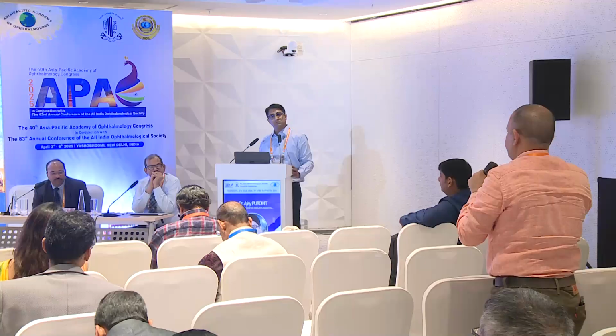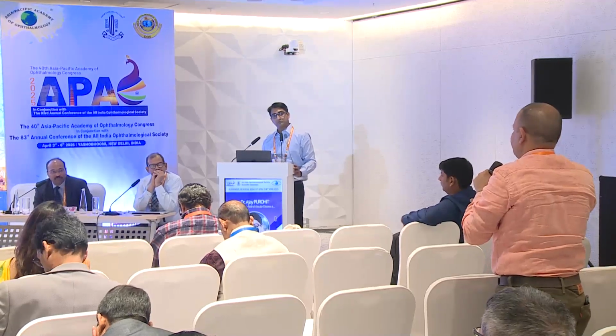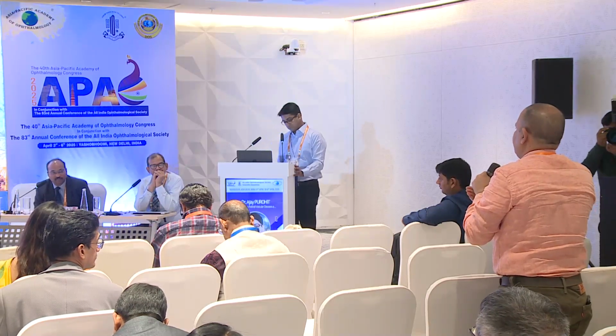Yes, sir. Please come. When there is diabetic macular edema, you are seeing a distorted DCP, so the edema itself can cause the artifact. I tried to look for this particular point, but I could not get a satisfactory answer on how to account for this distortion caused by the edema in the DCP. Because most of the time we keep saying that DCP is the first to get affected, but if you look at cases where there is no edema, you don't see that much of a difference between SCP and DCP. So how do we account for that when you have edema?